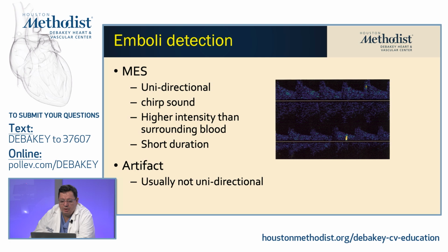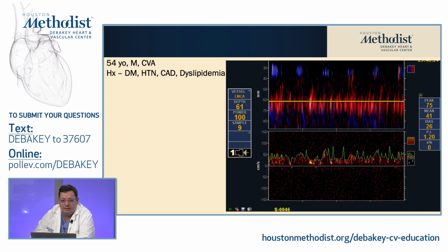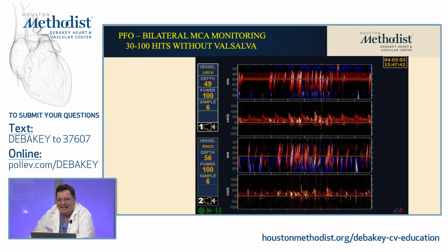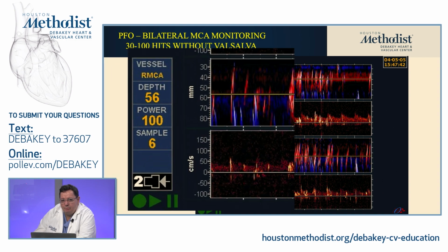When we are injecting, again, this is how it looks on the TCD. These different signatures are variable, so you have a totally different brightness of all these microsignals because they're different sizes. When we're doing a bubble study and we are injecting saline, these are uniform particles. So pay attention that if there's a bubble coming from a saline or any injection, they are more like uniform microembolus signals you're going to see in the spectrum.